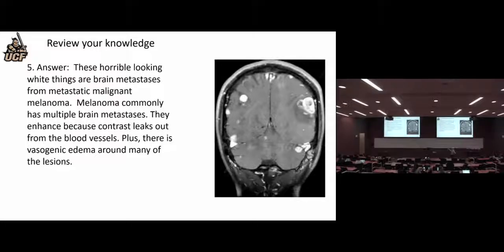This has to be contrast. This has to be contrast. And I think I see some contrast in blood vessels here. So this lit up, and so this is probably leaking from the tumor, and then some additional edema, which has a little bit of contrast in it. So anyway, multiple metastases like that are not that uncommonly seen in melanoma.